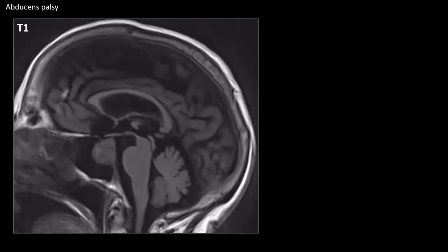This is another patient, and this patient presented with an abducens palsy. And if we look at the sagittal T1 weighted images, at first glance, we'd say, oh, this could be a pituitary tumor. But what is a bit strange is that we would expect the lesion to cause a bitemporal hemianopia, but, well, doesn't have to be. There is no compression of the optic chiasm. Nevertheless, abducens palsy caused by pituitary adenoma is not that frequent, but it's possible.